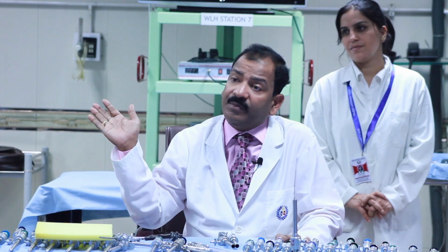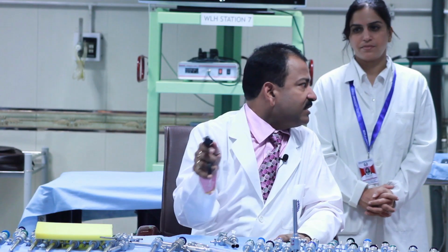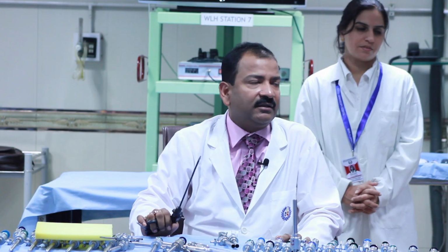So what about laparoscopy? If I am too near, I am bad. If I am far away, I cannot operate better. So always maintain your distance from the screen at 5 times the diagonal length. If you have a high definition monitor, your distance will be a little more, because high definition monitors can project the image on a bigger screen also.